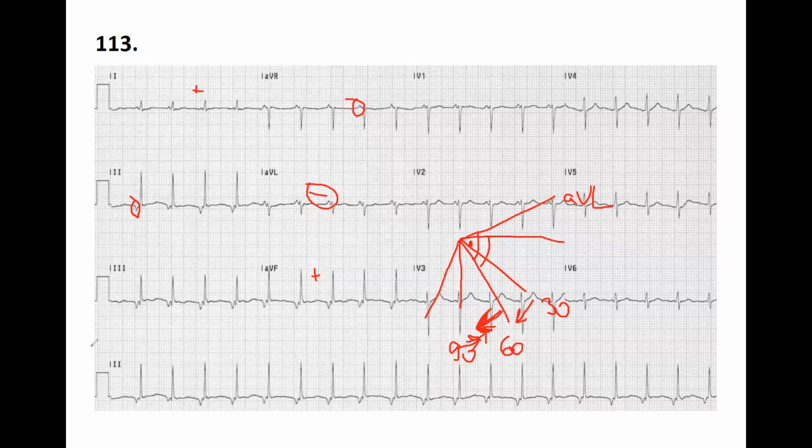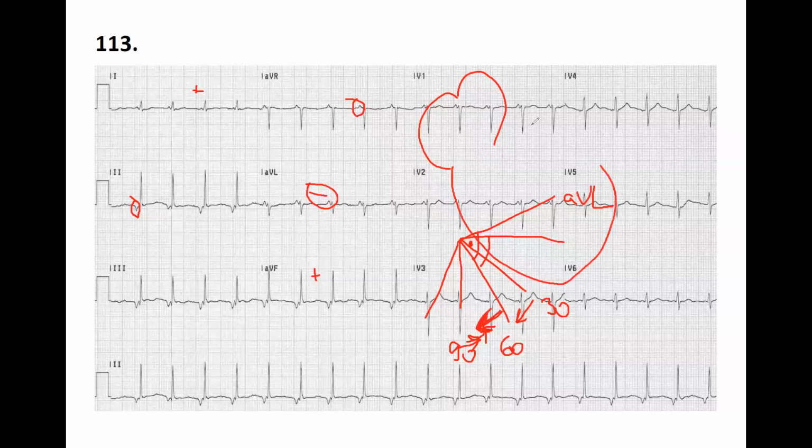When I was doing that, what I was confused about is that after the inverted P wave, there's still a little bit of elevation. I was confused whether that little elevation is the P wave or the inverted one is the P wave. No, that's inverted. This is an inverted P wave, meaning, as I said in this video and another video, that the impulse formation center is in the middle between the atrium and the ventricle.